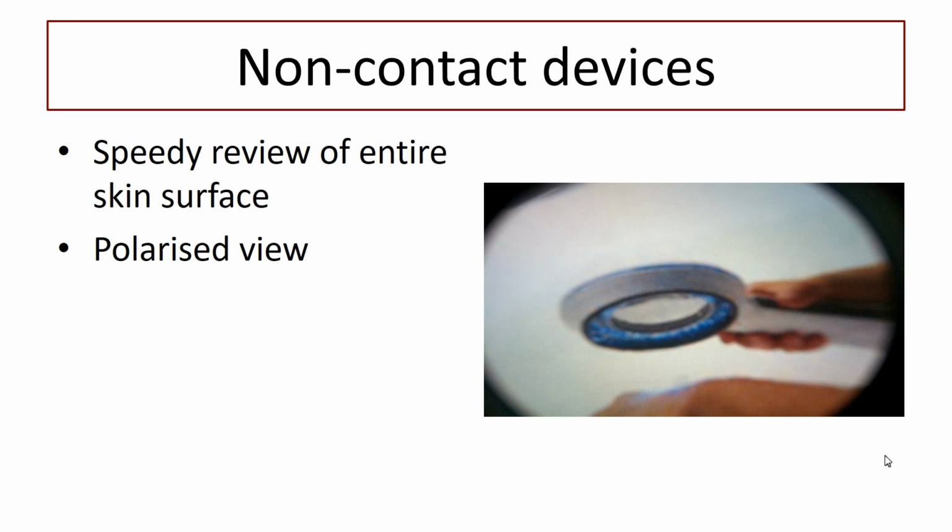So most people's consulting rooms are not light enough. Or you have light coming from the top, and you have your patient standing up and you can't see their legs. You need a bright light. Most of us do require magnification, and those two are polarized. So the larger one is ×2 magnification, quite enough for a quick check, and the other one is ×4, and obviously the smaller one is less expensive, and they are expensive.